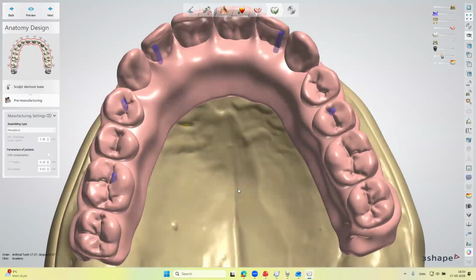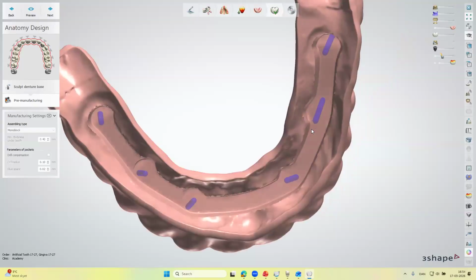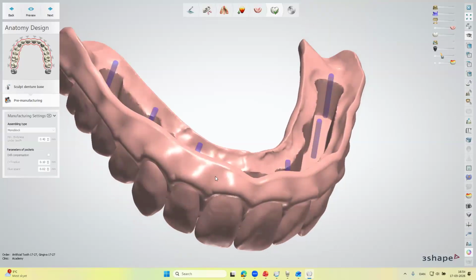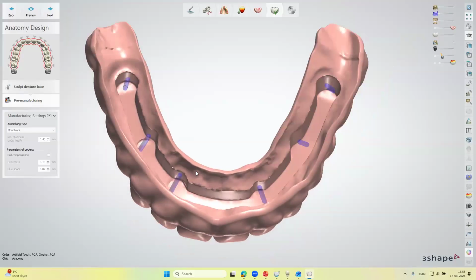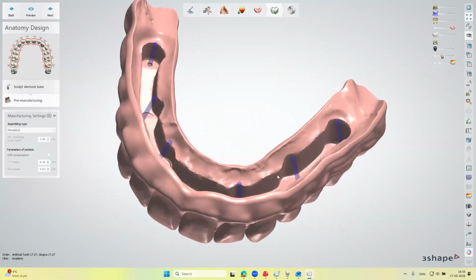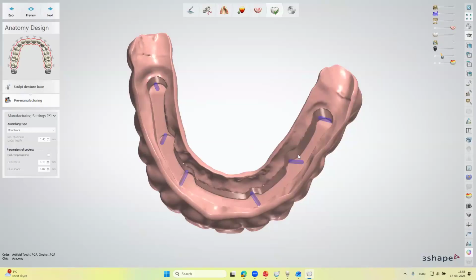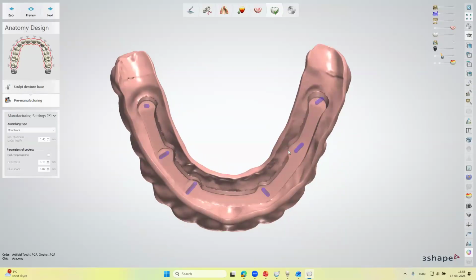All right, so this obviously will come as a one file, and as you can see, it also creates a space, creates a pocket for the bar. So that should go over our primary design. If you would like to have it narrower, sure, that's absolutely fine. If you will have difficulties creating the holes right through this design, you can see that they are still enabled in here.